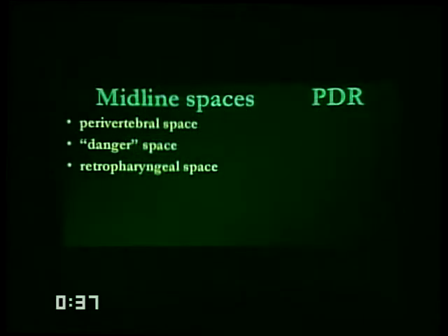The retropharyngeal space is behind the pharynx and hence retropharyngeal. If it's behind the nasopharynx, it's retronasopharyngeal. If it's behind the oropharynx, it's retrooropharyngeal, and similarly retrohypopharyngeal. The main constituent of the retropharyngeal area is going to be a lot of lymphatics and lymphoid follicles.